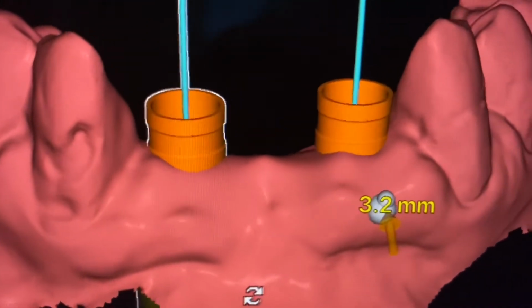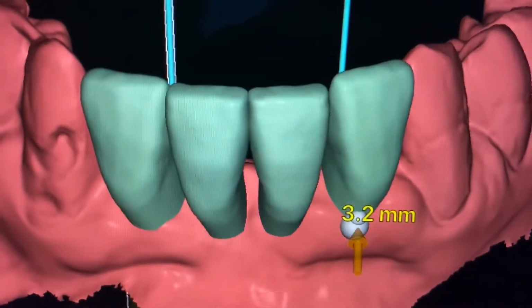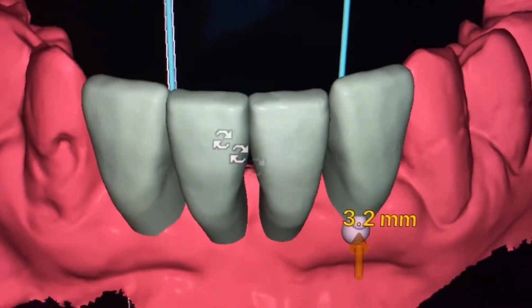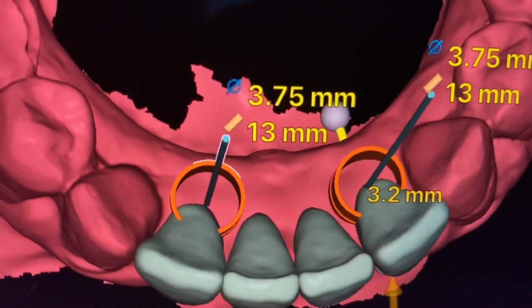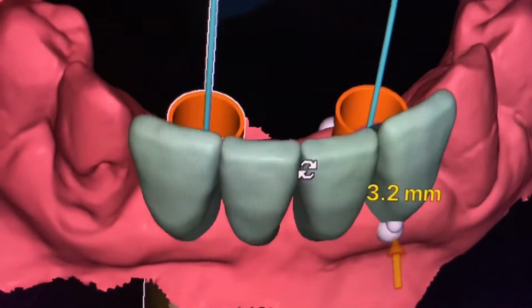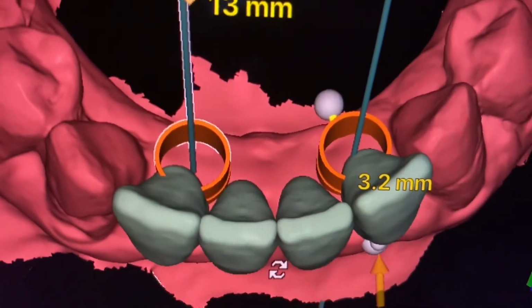And this is dictating the way that these implants will be, unless you're going to graft, which I wouldn't do in this type of case. But as we look at this case, you can see that we want to have this coming through the lingual aspect of the 2 laterals. And so ideally the wax up even would be a little bit more to the lingual when we're doing this, but you can generate this when we're using the resin, as I'll show you in a second.